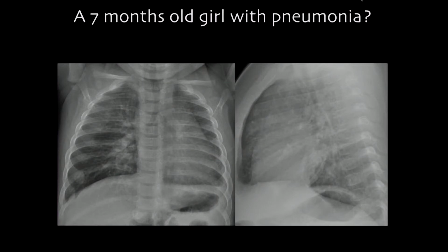So here in this case, the heart is actually displaced to the left side, and the airway is displaced to that side too, and the aortic arch is a right aortic arch. The patient doesn't have tetralogy of Fallot. So situs solitus, levocardia, small left lung with right aortic arch, and then you should have the diagnosis. Okay, what is that?